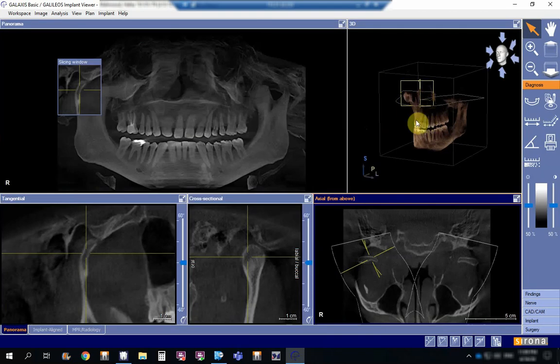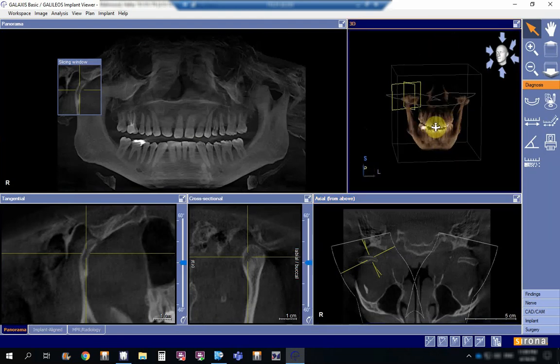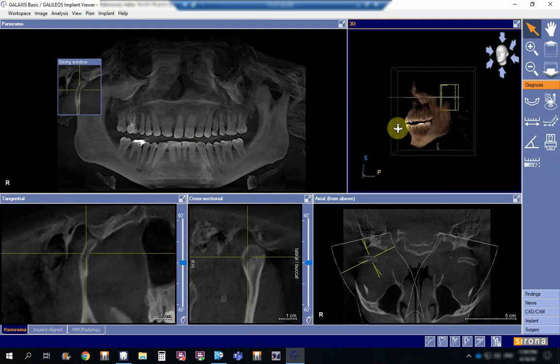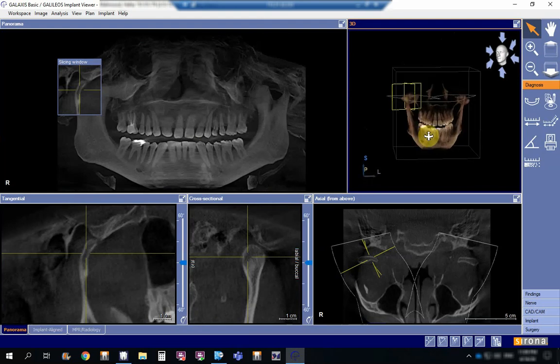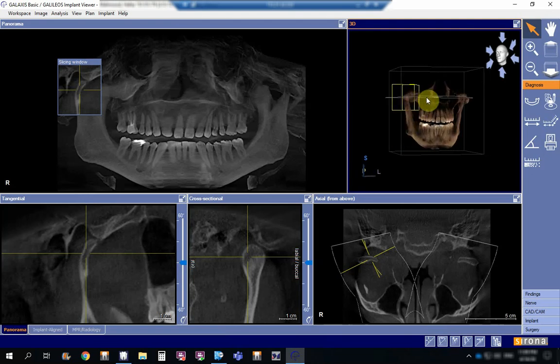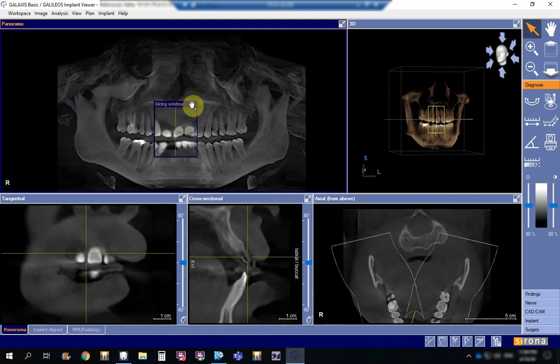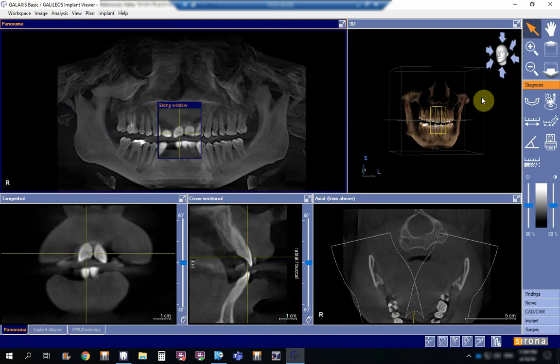Let's go to the last window, which is the 3D reformatted window. What's this? I will enlarge. Anyway, before enlargement, see, with the left click of the mouse, I can rotate to either side, and these are my planes of direction. This is posterior, this is lateral, and this is superior, as you can see in here. And this level tells you where I am in the other planes. So I'll go back to the midline. See what happens. Now I'm in the midline.